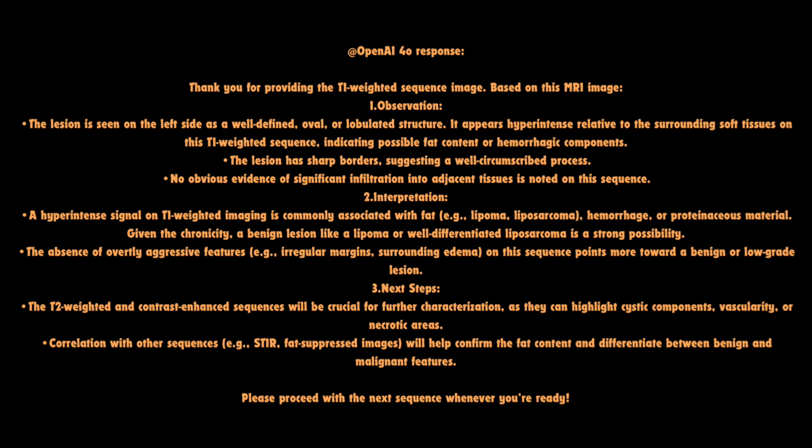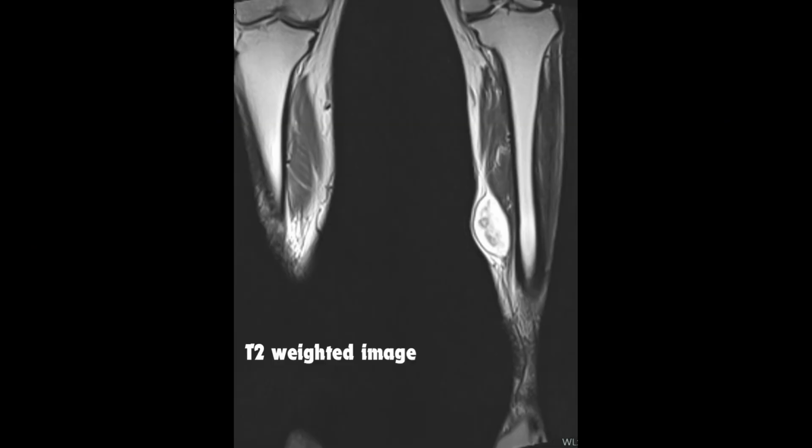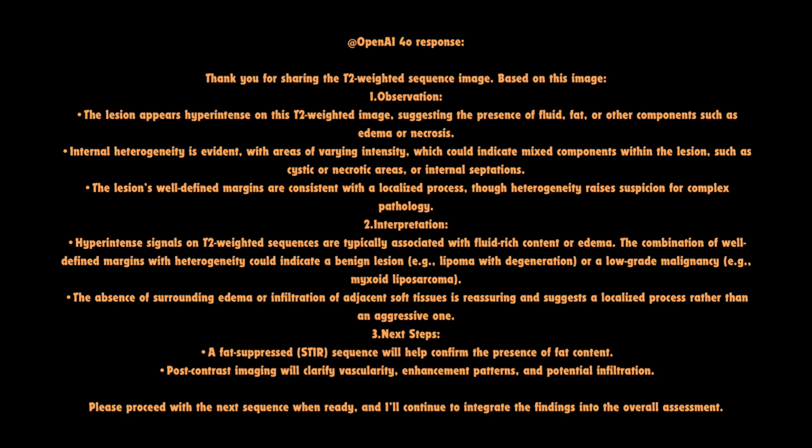Nope. Then came the T2 weighted image. Okay, what's different about that one? Well, the T2 helps us see the makeup of the tissue a little better. And this time, the area was bright again. But it wasn't uniformly bright, meaning there was probably a mix of things going on in that area. So more complex than just fat.